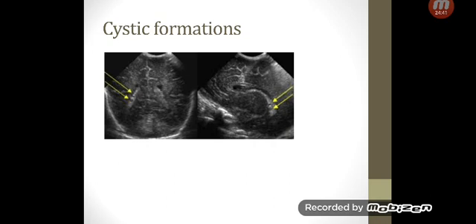And to be honest, the key so far with IVH, with hydrocephalus, with PVL, from the cranial ultrasound point of view, is the follow-up. You don't just localize an abnormality and say, oh, it's there. You need to see how it progresses. You need to see if it's evolving or devolving, and that will always guide your management, and that will also guide your expectations.